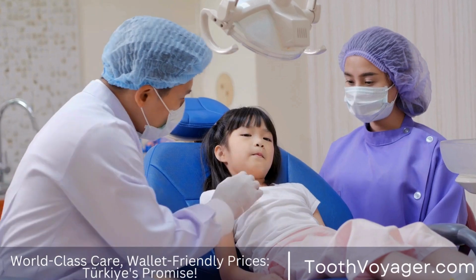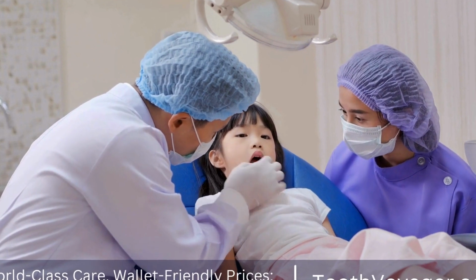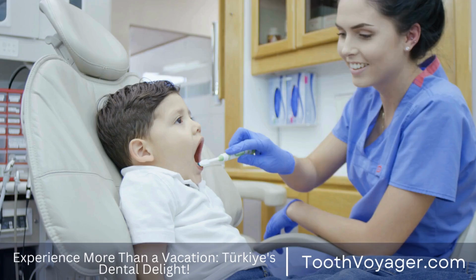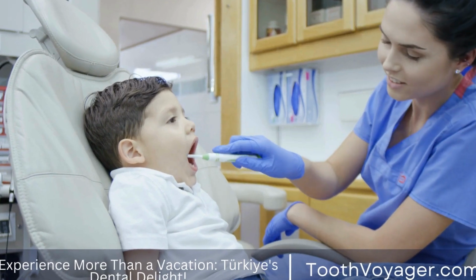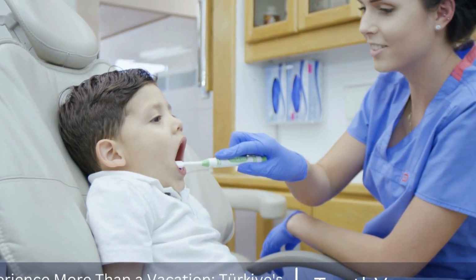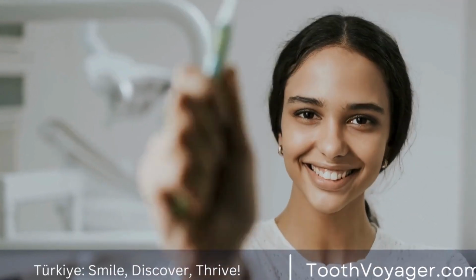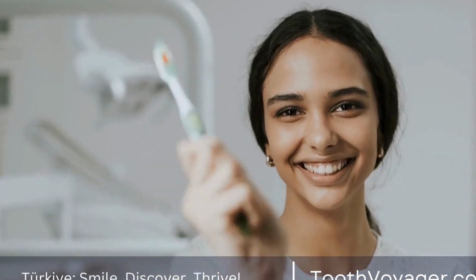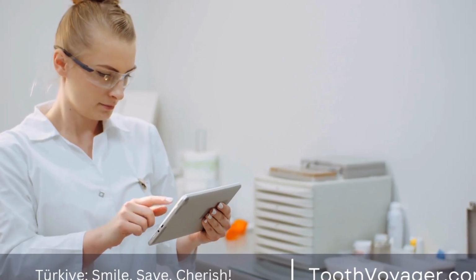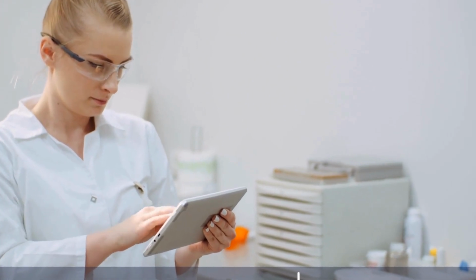Making dentures that are comfortable to wear requires a knowledgeable and experienced dental technician who can design prosthetics that will fit comfortably in the mouth of the patient. This procedure involves a series of phases, starting with an initial meeting with the patient through the fitting and finalization of dentures. The very first step in denture fabrication begins with a meeting with the patient. At this point, the dental professional will evaluate the oral health of the patient and will discuss the patient's specific requirements as well as expectations.